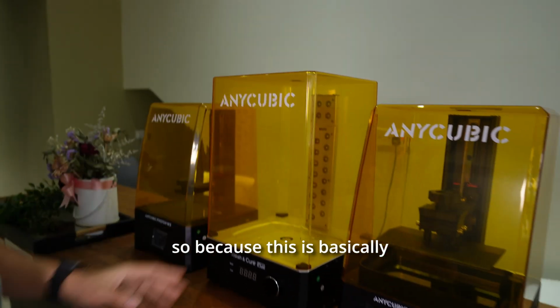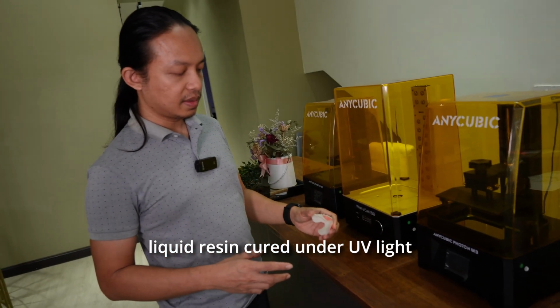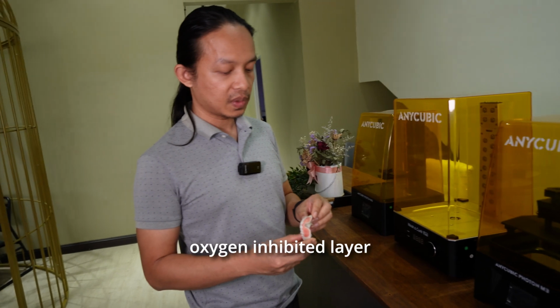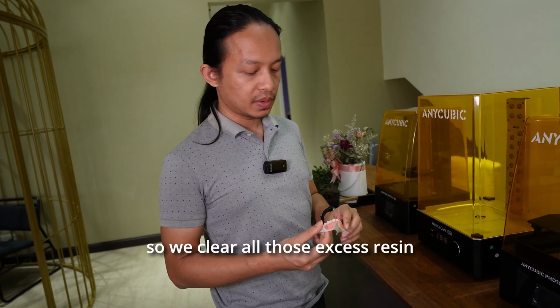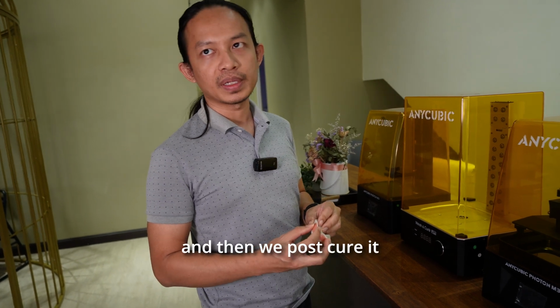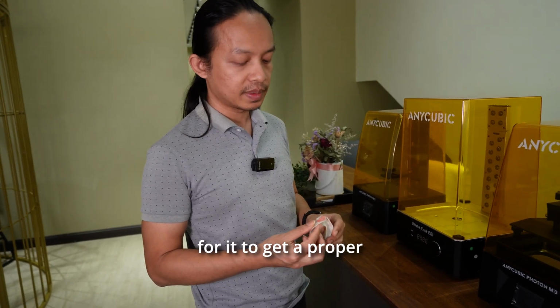Because this is basically liquid resin cured under UV light, similar to composite, they have an oxygen inhibited layer. So we clear all those excess resin, and then we post cure it to get a proper curing setting.